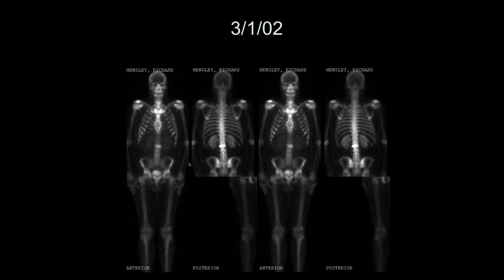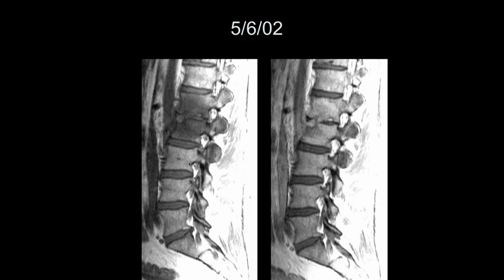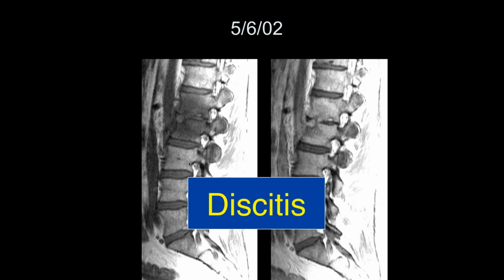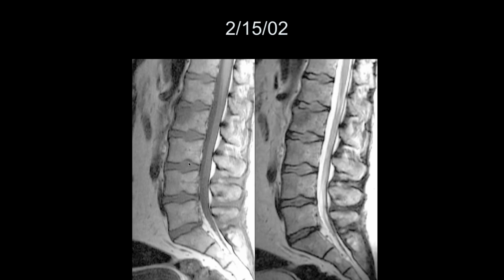Okay, so that's 3-1. Now we go to 328. Okay, so it was infection, and now it's extending to the adjacent bone. And that was just infection. So we go back to this is the typical way these occur. As I said before, you tend to get hematogenous spread to the small vascular spaces near the end plate that starts the osteomyelitis at that point.